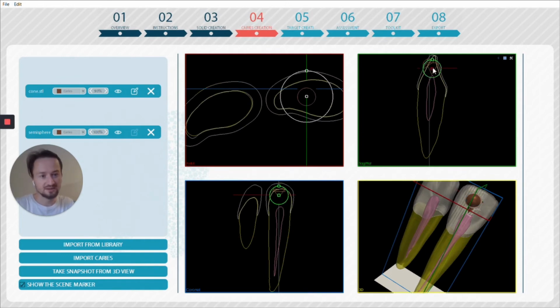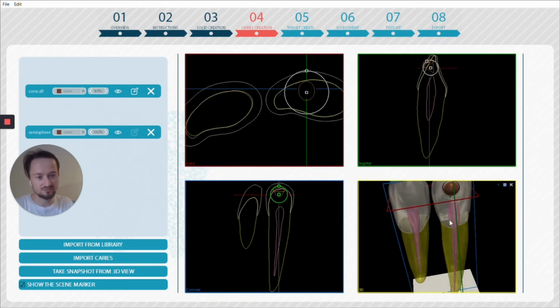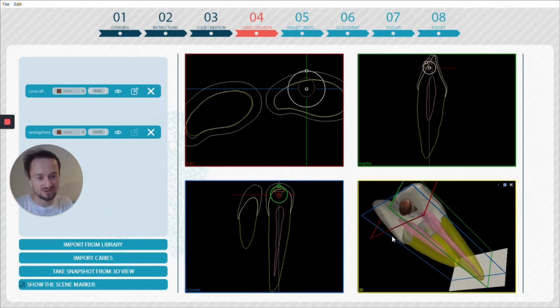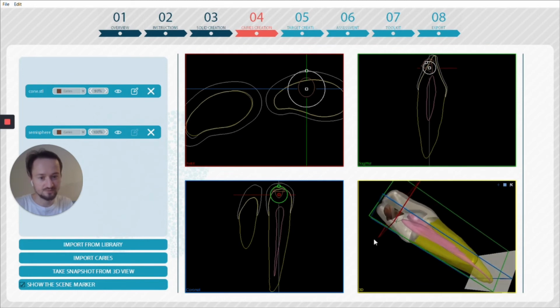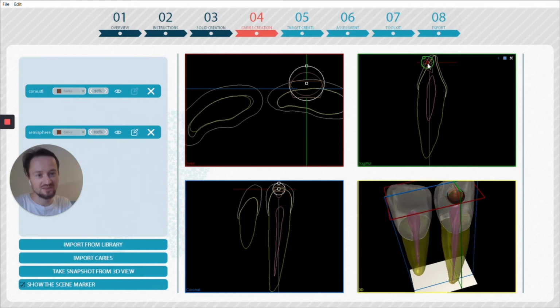And again, I'm going to drag that across and rotate it and bring that across. There we go. So they're more or less matched up, and I could spend a little bit longer playing around to make sure I get them perfectly. But when you're happy with the basic shape, then we can move across to the target creation.